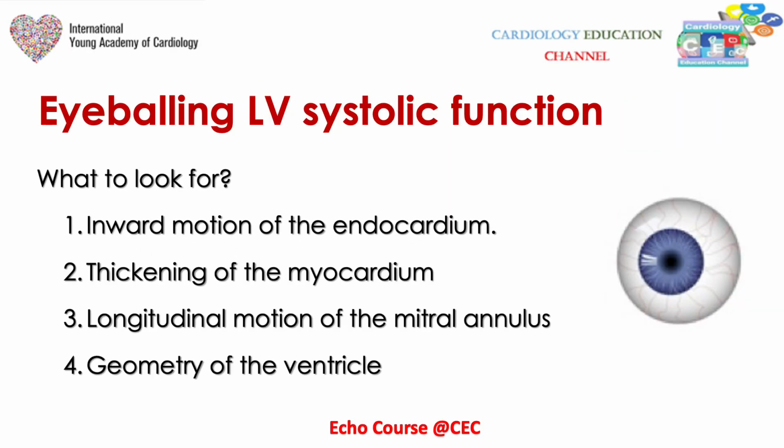And what to look for? You are looking for the inward motion of the endocardium, the thickening of the myocardium, the longitudinal motion of the mitral annulus in the apical four-chamber view, and the geometry of the ventricle itself.